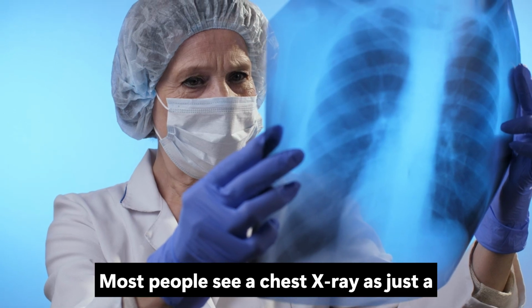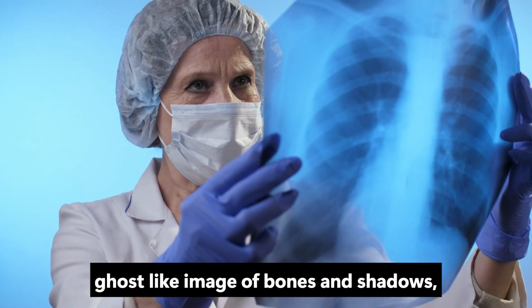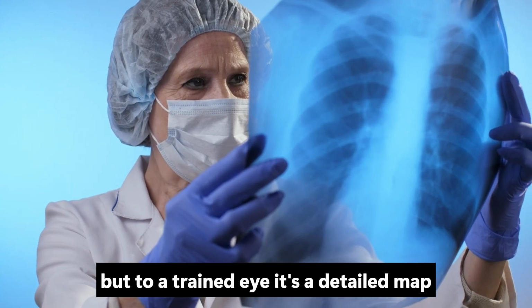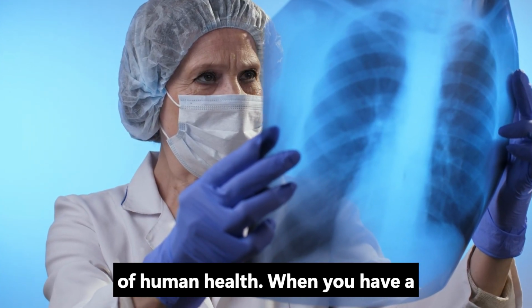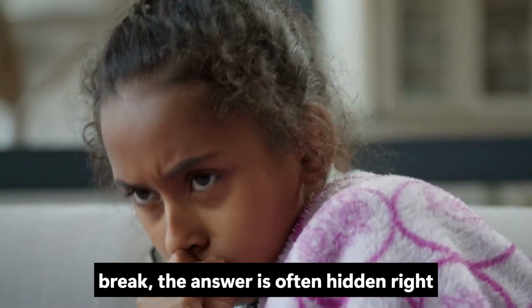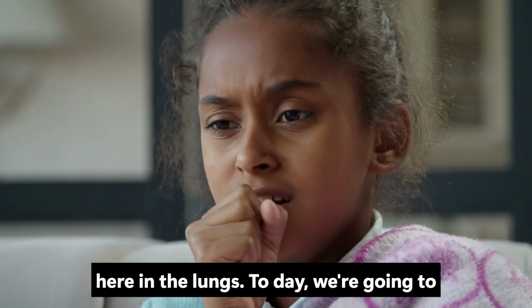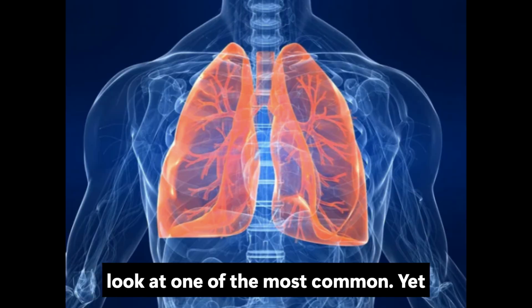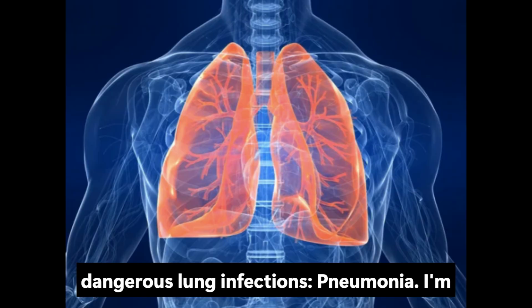Most people see a chest X-ray as just a ghost-like image of bones and shadows. But to a trained eye, it's a detailed map of human health. When you have a persistent cough or a fever that won't break, the answer is often hidden right here in the lungs. Today, we're going to look at one of the most common, yet dangerous, lung infections, pneumonia.